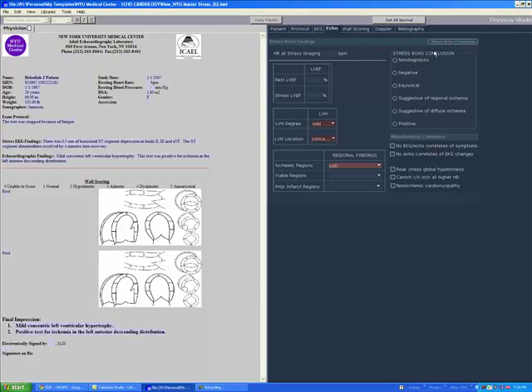With respect to the final stress echo conclusion, again, it's mutually exclusive. You can choose only whether it's non-diagnostic, negative, equivocal, suggestive, or positive for ischemia. Again, if I click positive, I can't click anything else in this box. Again, if I don't like any of the selections, you just click the one that you selected. The appropriate verbiage is done and will show up in the report. So let's say that this is a positive report, stress echo is positive for ischemia, and since we specified LAD distribution, that will also be specified in the report. I hope this video tutorial helped you. Good luck.